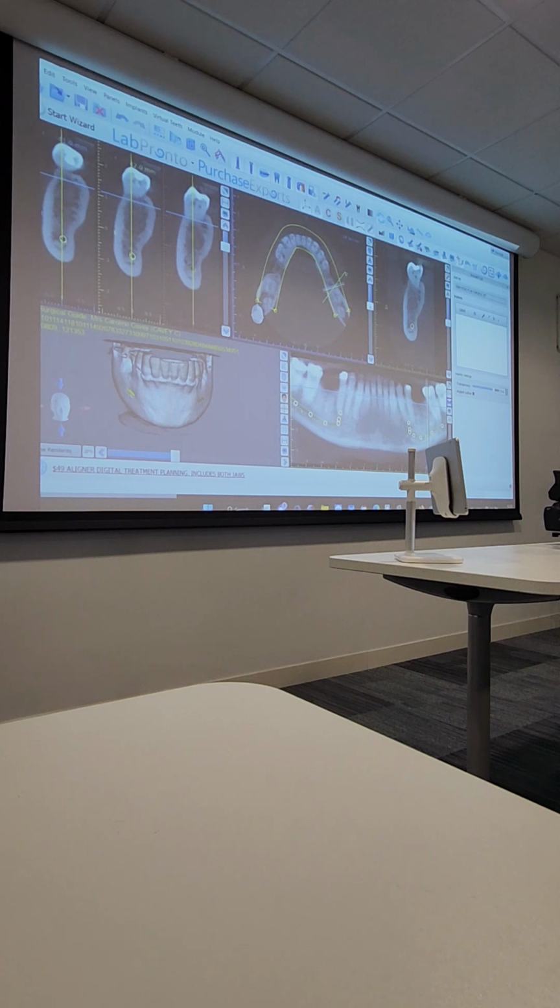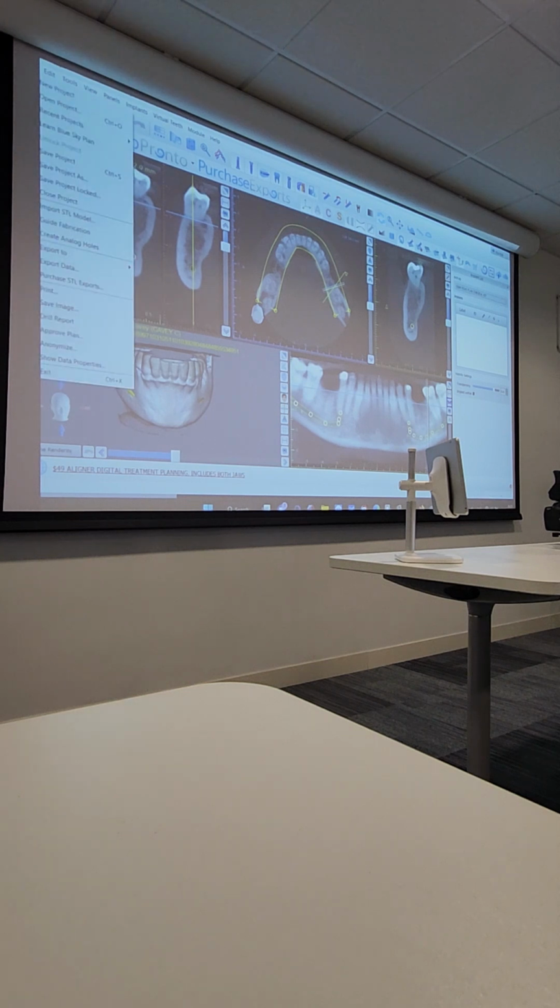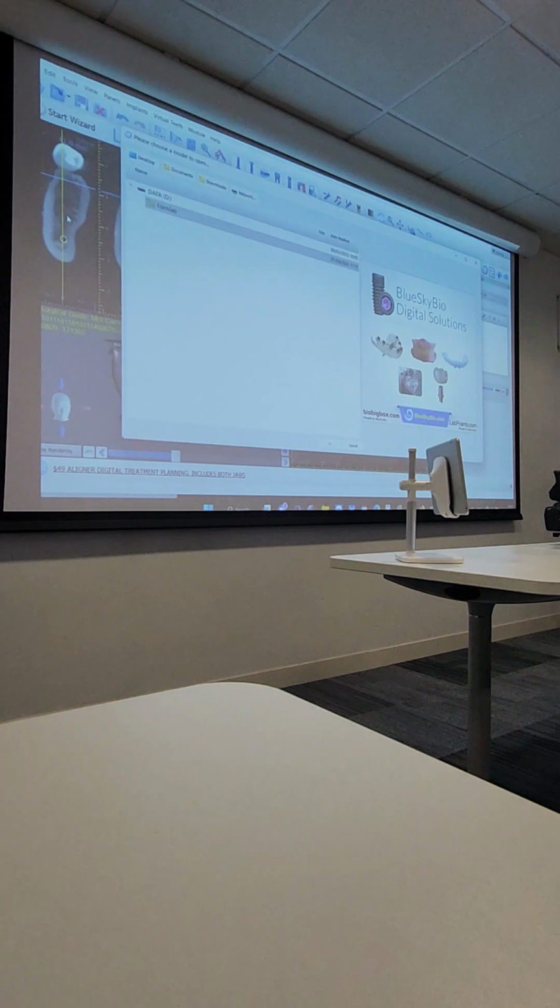Okay? Now what we're going to do, obviously we've got our DICOM, we're going to go to Files. What do we need to do now, guys? What do we need now? Exactly, you need your surface anatomy. So if you go to import STL model, got it? From where? MN1 and then 5. Import STL model, from the 5. STL model.